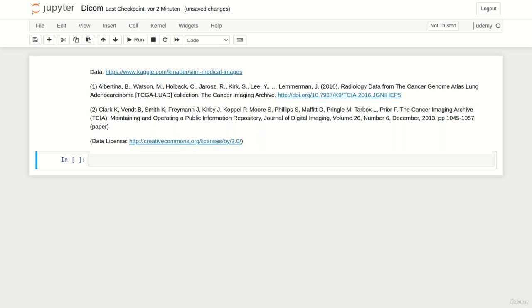Hello everybody and welcome to our first programming lecture of our lecture series Data Formats and Preprocessing. In this lecture you will learn how to handle DICOM files in Python.